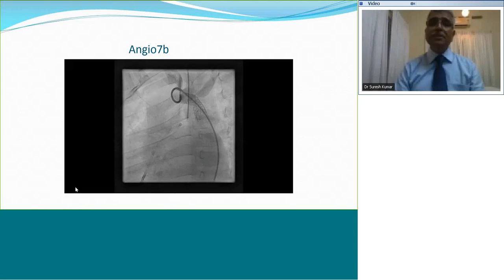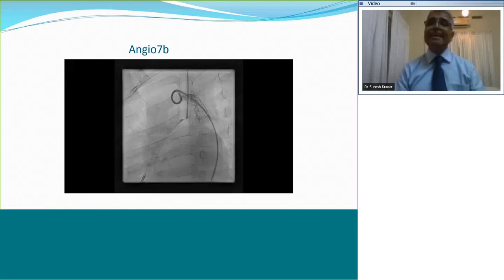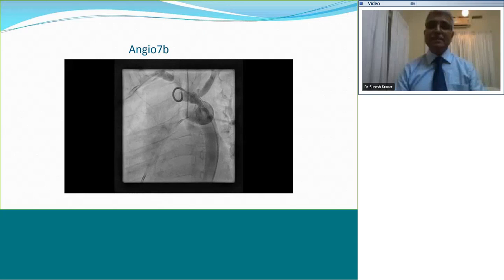I hope you can see the image. This part you should be able to say. I need a response, because otherwise you need to explain and move on. Please. Again, I'm giving the 10-second deadline for me to tell you what it is. Okay, no response. The 10 seconds is over.